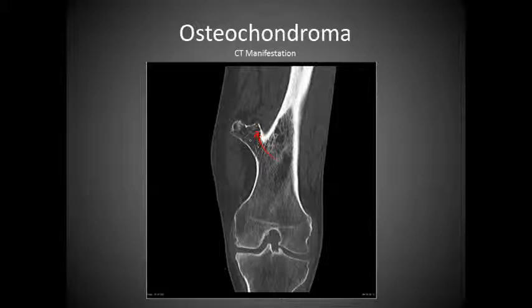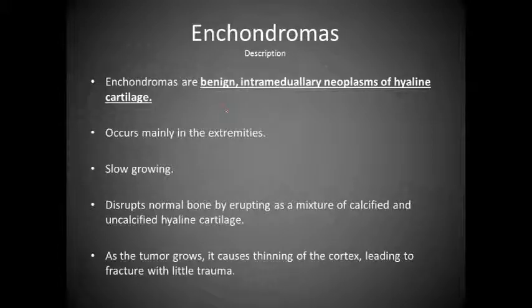Notice how the bone just continues growing out, and there's no periosteum to kind of close it off, so it doesn't look like it's just something that has decided to grow on later, but it actually looks like part of this bone, and it has the normal bone matrix inside of it as well. But as you can see, it causes significant problems with the tendons and muscles on the inside, and so this can cause severe irritation and can be quite painful.